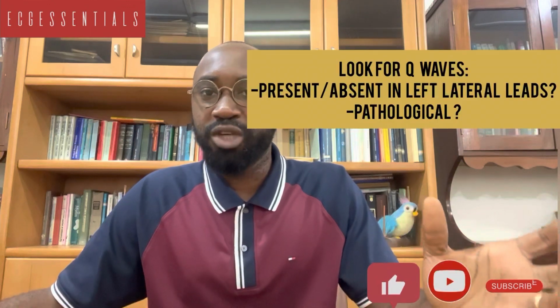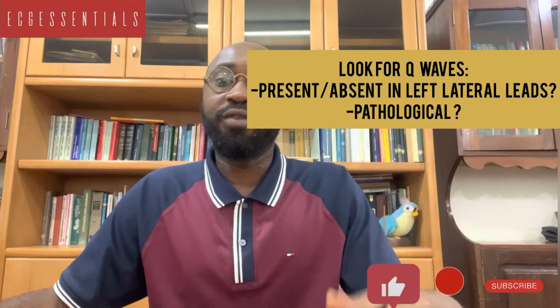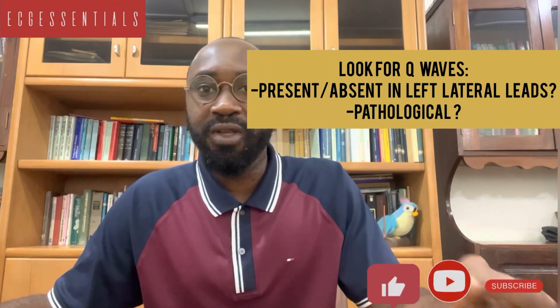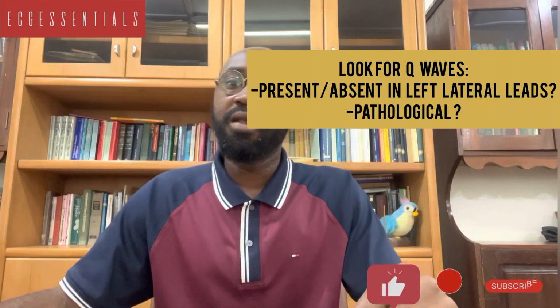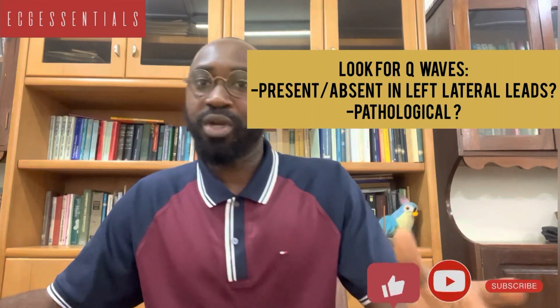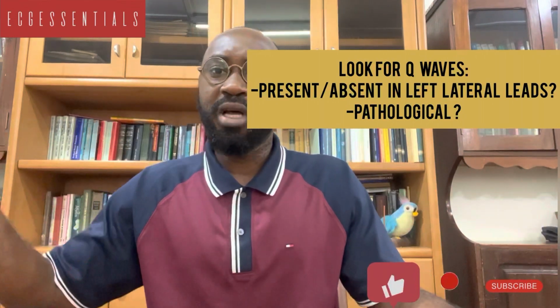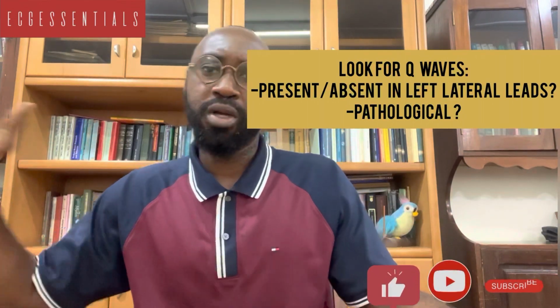We mentioned that the Q wave is the initial negative deflection of the QRS complex. And we said that we expect to find these small Q waves in the left lateral leads. So for any reason at all, if you look at V5, V6, and AVL, and we do not find the Q waves, together with other findings, of course, it may give us an idea whether there's, for example, a left bundle branch block.